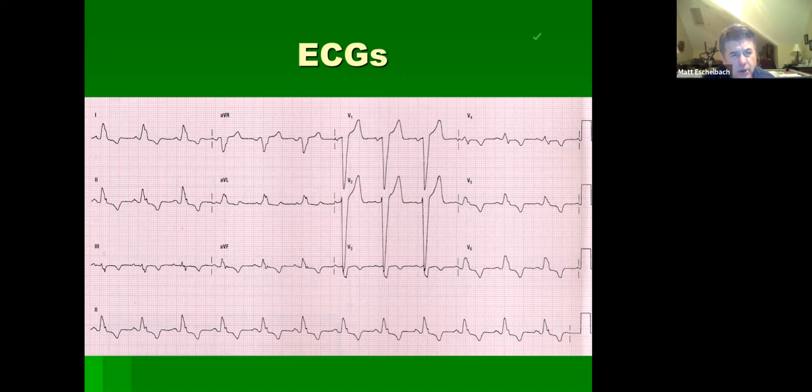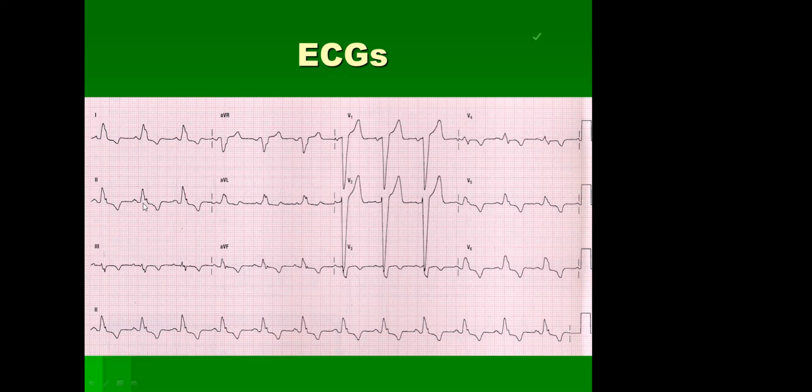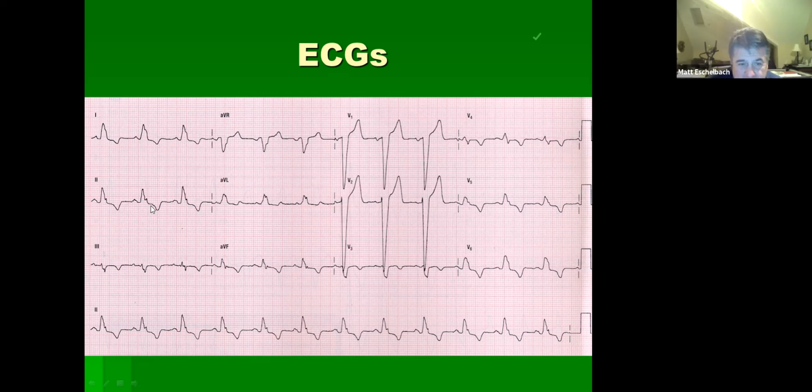So when a QRS widens, what do we see right there? Do you see this right here? I call that, it's a very sophisticated name, I call that a hitch in the giddy up. All right, I see it here too.